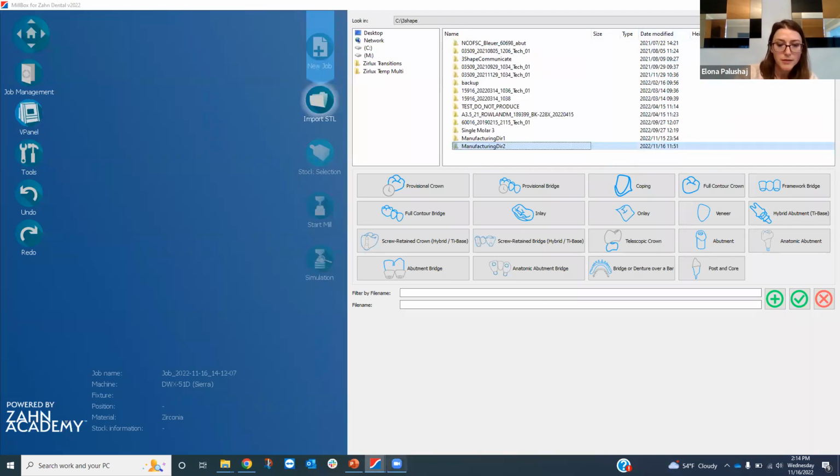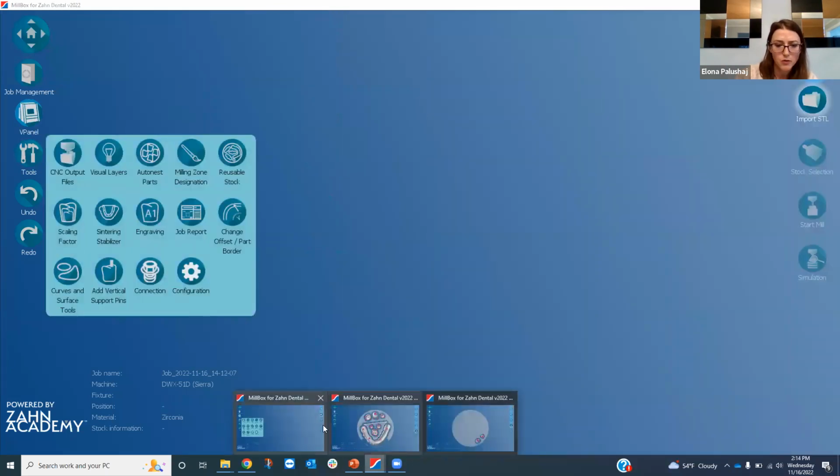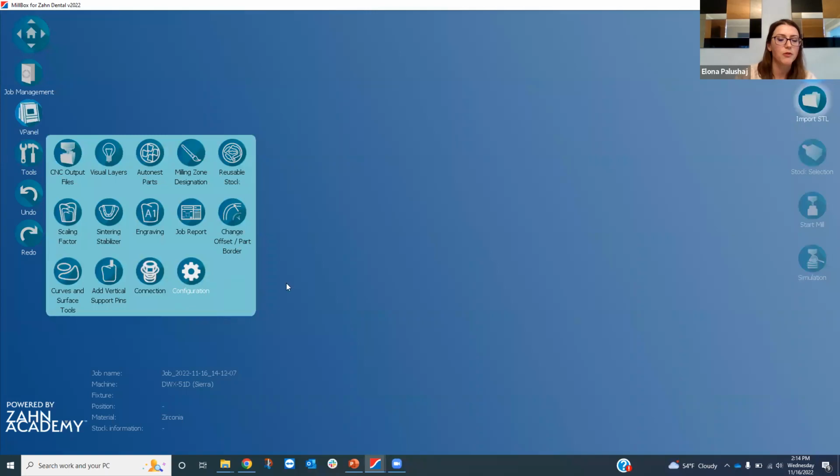All right. So again, under tools, I might have that open already. No, tools, configurations.